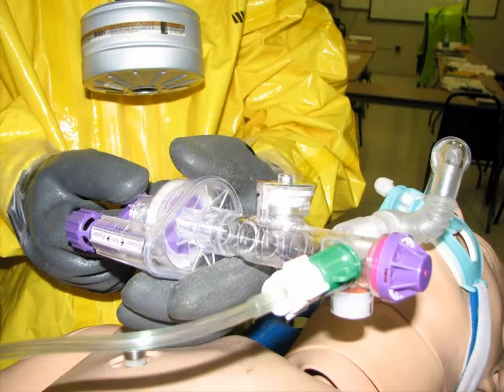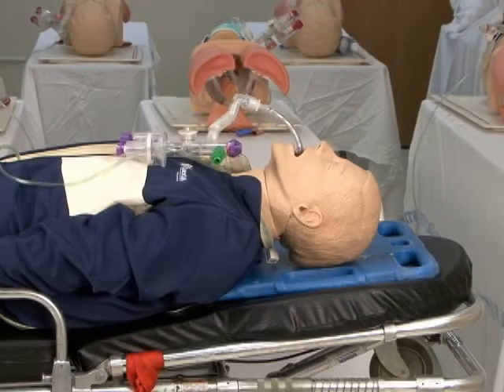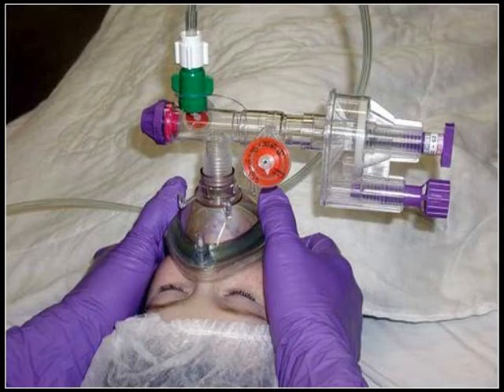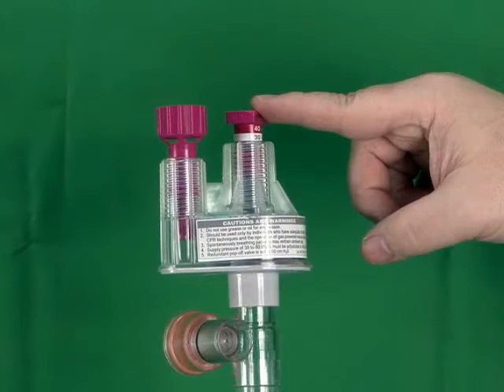Once you have performed the function check, connect the automatic resuscitator to the patient. Ventilatory support will begin immediately. To connect the automatic resuscitator to a patient with an endotracheal tube, simply attach the patient connection port to the tube. Because of the reliability of an ET tube and airway management, this is the preferred method of connecting the patient. The automatic resuscitator may also be connected using an appropriate CPR mask. It is very important to be thoroughly trained in the correct use of the mask before attempting to use one with it. Step 3. Adjust the rate dial to the desired rate.